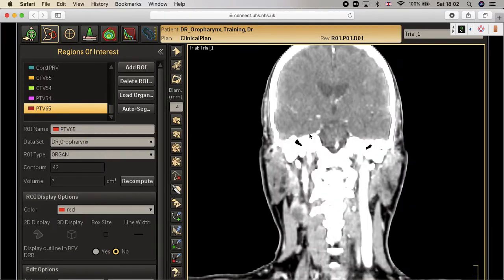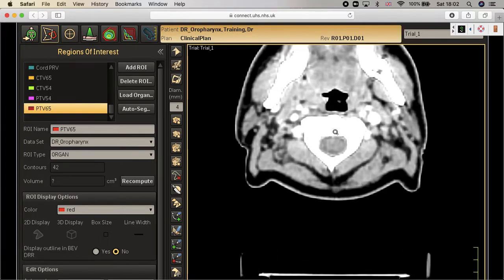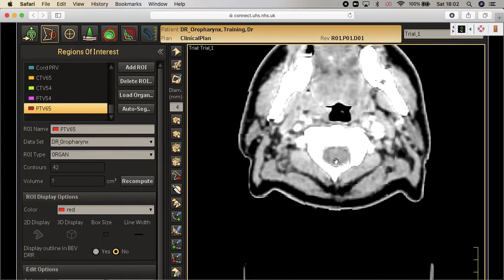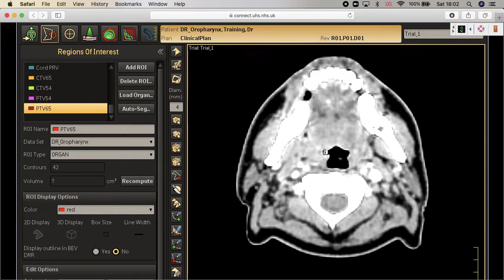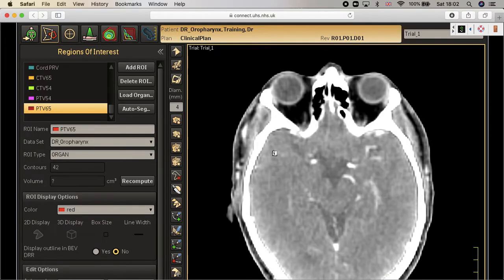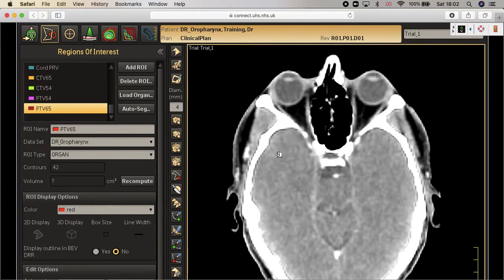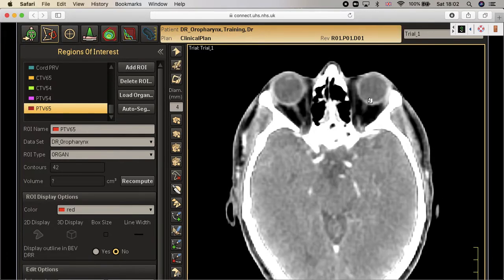Okay, good. Let's go for the axial view. Open your planning system now, and let's go to the axial view, and let's see what kind of risk structures we can draw in brain tumors or in head and neck cancer patients. So let's go up in the brain and let's see what we can do. As in any planning system, for any structures in any brain or head and neck case, I would suggest you draw the eyes. We don't have to spend time looking at the eyes and drawing them. This makes no sense.